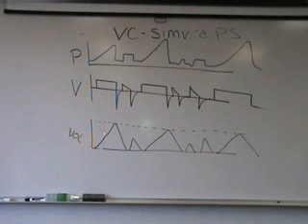And then finally, when I look down here at my volume deliveries, on my volume controlled breaths, which would be this breath, and this breath, this flow pattern, this flow pattern, this flow pattern, I'm delivering a set tidal volume that's always the same because this is volume control. On the pressure supported breaths, I am delivering different volumes depending on what the patient pulls, because pressure breaths don't determine what the volume is, and it isn't always constant because pressure breaths control pressure.